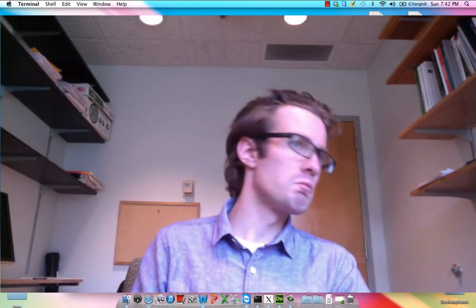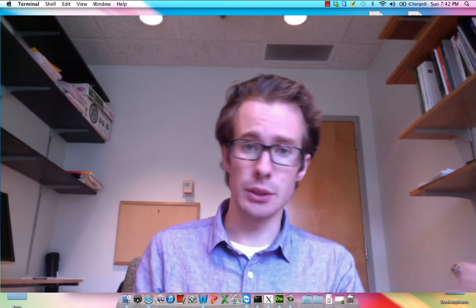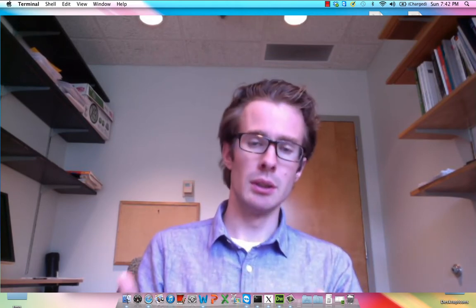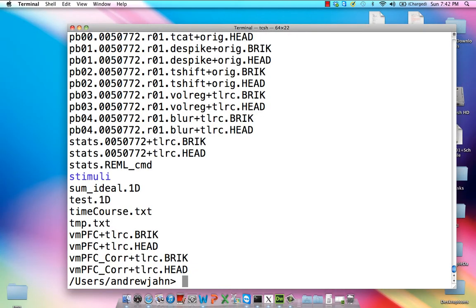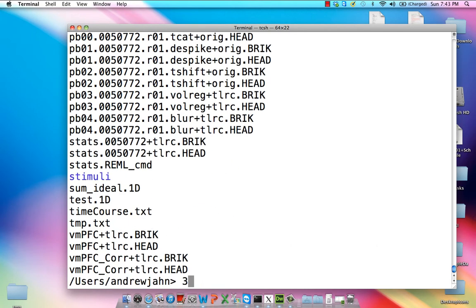It takes about 20-30 seconds to do. So if you're going to use that, just a little caveat, it's not super precise, but for your purposes, maybe it's what you want. What I've done here is I've already run 3dSeg. Once you do that, you are left with a folder called Segsy. 3dSeg is very simple. It's just 3dSeg -anat and then your anatomical image, in this case could be MP-RAGE.